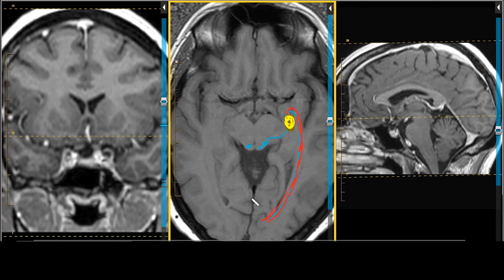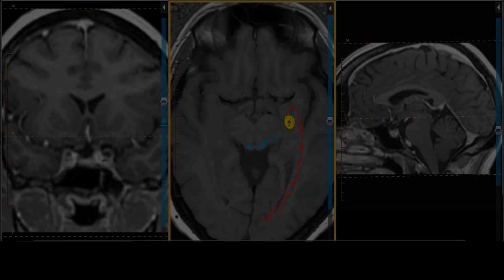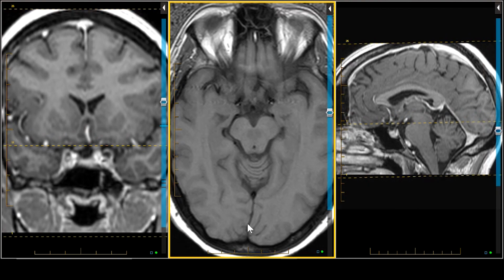Anterior to the calcarine sulcus is the superior lingual gyrus right there. Then you've got the sulcus itself. And if we scroll a little bit, immediately behind the sulcus is a little small nubbin of a gyrus known as the descendens gyrus of Ecker.